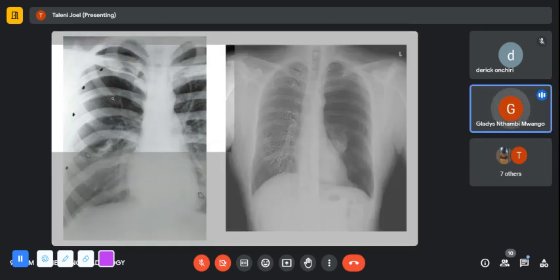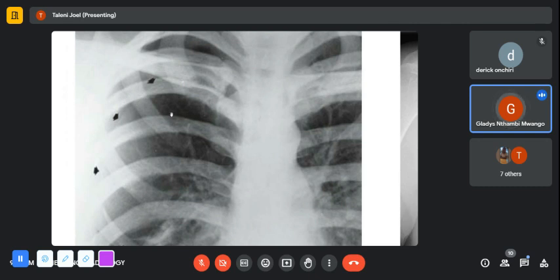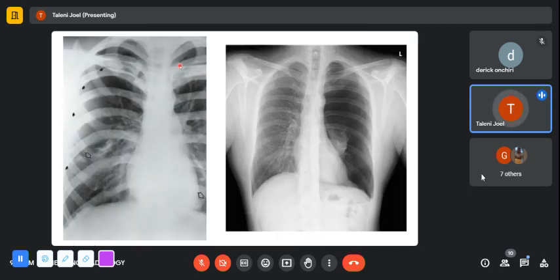That's the main thing. When you zoom in, you can see the pleural line quite clearly, and beyond that you don't see any vascular markings. So that definitely is a pneumothorax. We need to look very carefully at our images, otherwise you could easily miss this.